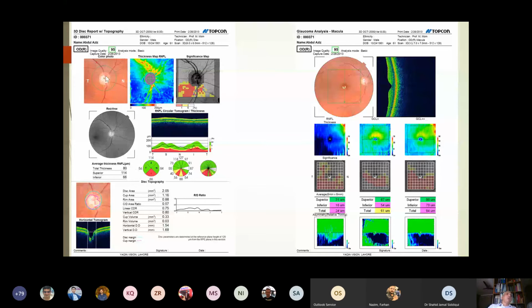And let's see what we thought was the cup to disc ratio. Looking straight ahead at the picture, we thought it was 0.6, but it is coming out to be 0.8 in this patient. And here the machine is actually trying to highlight the area of inferior notching, which we're trying to figure out. Because we need to remember the cupping is actually where the blood vessels are turning, rather than the area of pallor which we see in this area. And here the machine is showing what it has taken as the opening of the optic canal, which is the Bruch's membrane opening, and here it has highlighted the points which are the ending of the Bruch's membrane, and this is the rim highlighted by the machine.